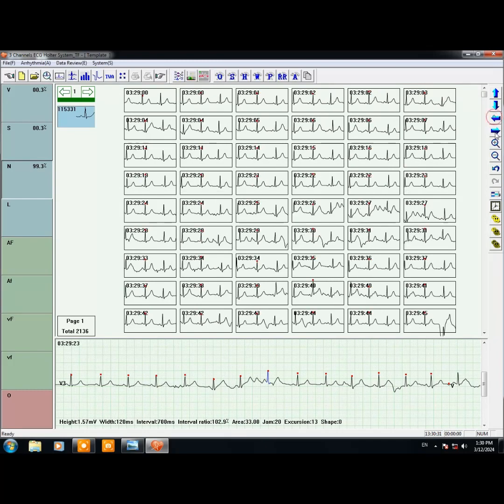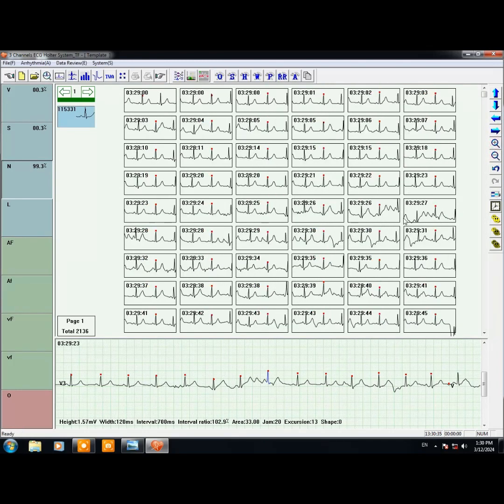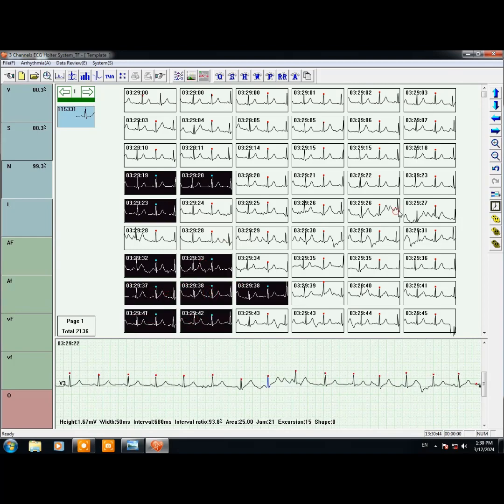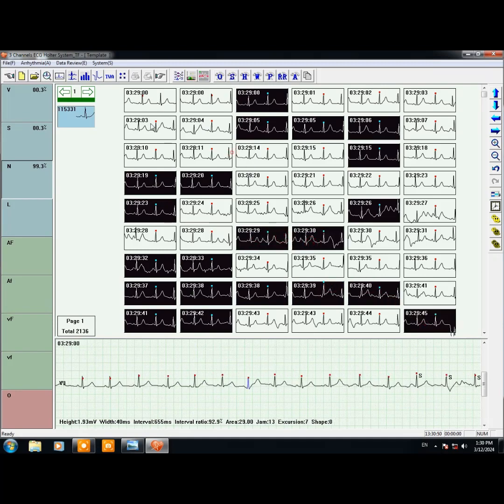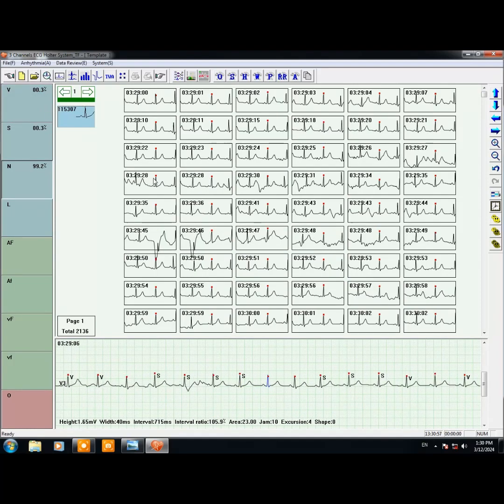We can move them, see them more clearly. You can zoom in, zoom out, and that's it. As I said, you can click on multiple, like so. Whatever order they are in, they will still all go to your designated class. Now they are all on the V.